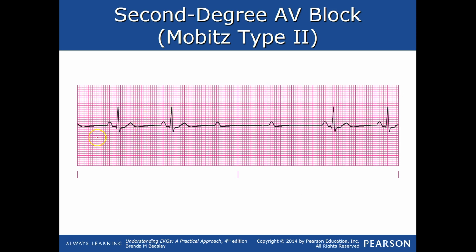Once again, let's take a look here. So looking at our rate and our rhythm and all of that, our rate, I mean, we're in the 40s, right? I mean, that's not a good rate. So we can expect that they're going to be probably kind of sick, bad cardiac output, maybe a bad blood pressure, color looks kind of sucky, maybe some chest pain, hypoxia, who knows, all that stuff that goes on with these sick people. So our rate's going to be somewhere around 40.